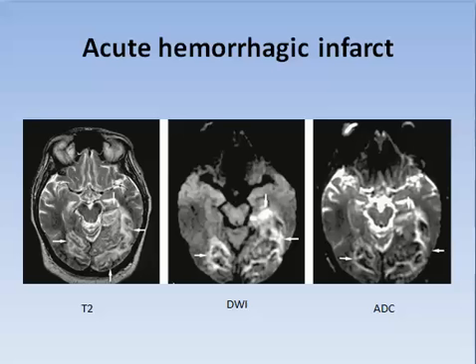Hemorrhagic transformation can show. This is not the one. This is acute hemorrhage, in which we have the heterogeneity, and we have the edema, and we have the hemosiderin, and we have the lesions there. So T2 is similar to diffusion, is similar to ADC. There is not much penumbra. Penumbra is here, which is not here. This is the penumbra. Not much of penumbra still, but we have the big core. This is hemorrhage with heterogeneous intensity, including hemosiderin and including edema.